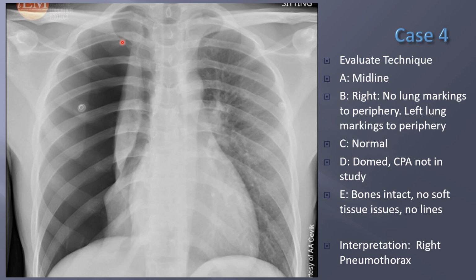If you're in the ER, you're decompressing with a needle and putting a chest tube in. If you're working night shift as a hospitalist, you need to call surgery, or if this is like an emergency, you can decompress with a needle to re-expand. Of note here, this border here is the scapula. So you see that border there. And this is just a snap from the gown that they're wearing.